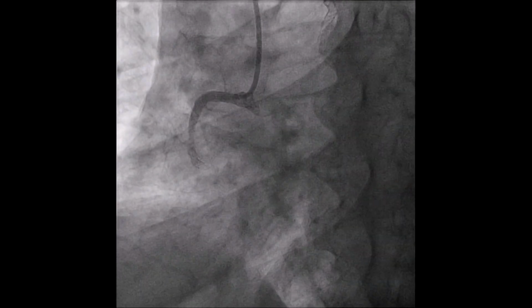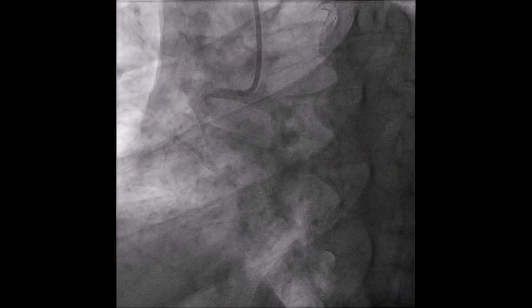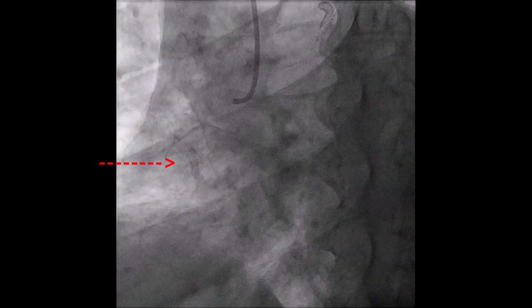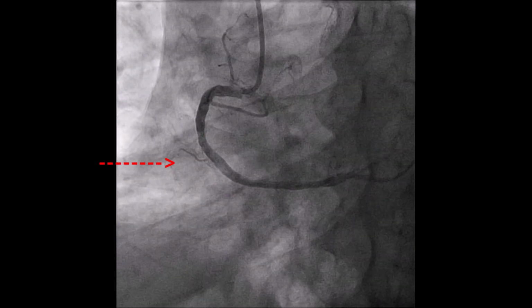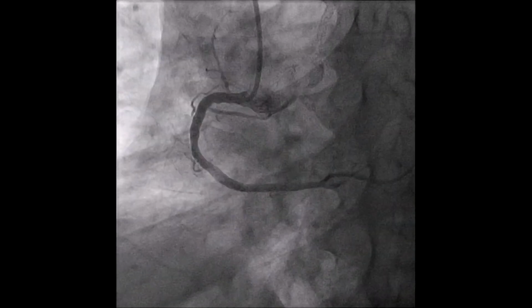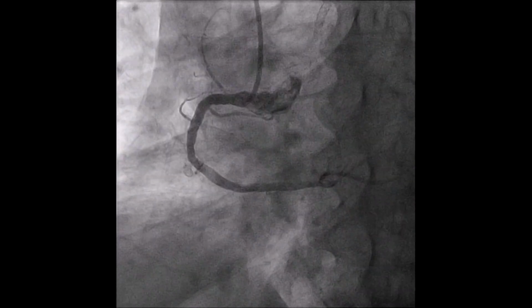a key finding came into view. Do you see it? It is right there, right next to the coronary artery. That's it. It is an old coronary stent, probably implanted in 2006 in an acute marginal artery that, although we cannot see it, we know it is there.